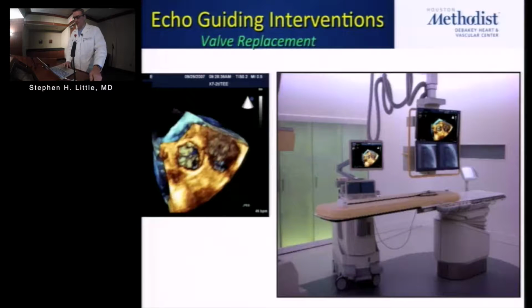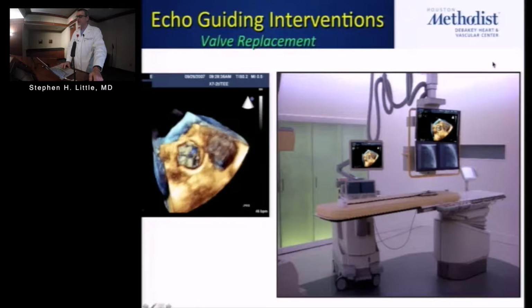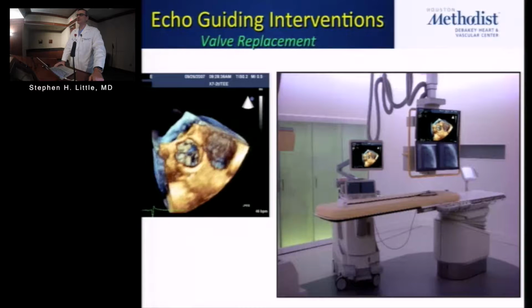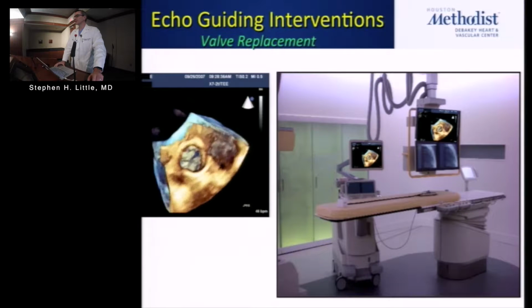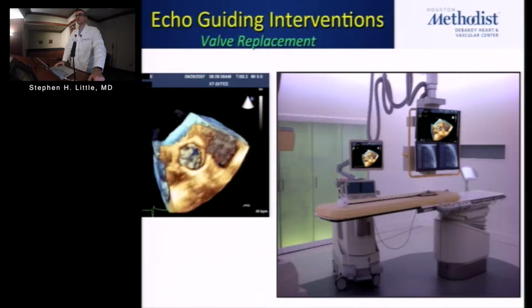Increasingly, as you know, we're going into the cath lab. Our echo images are being displayed onto bigger and bigger monitors, and the interventionalists are becoming more and more dependent on echo images. So fluoro time is dropping, ultrasound time is increasing. There are lots of issues around that in terms of manpower and radiation safety, but know that the echo is not in addition to the fluoroscopy, and for many of these procedures, the echo is actually replacing the fluoroscopy.